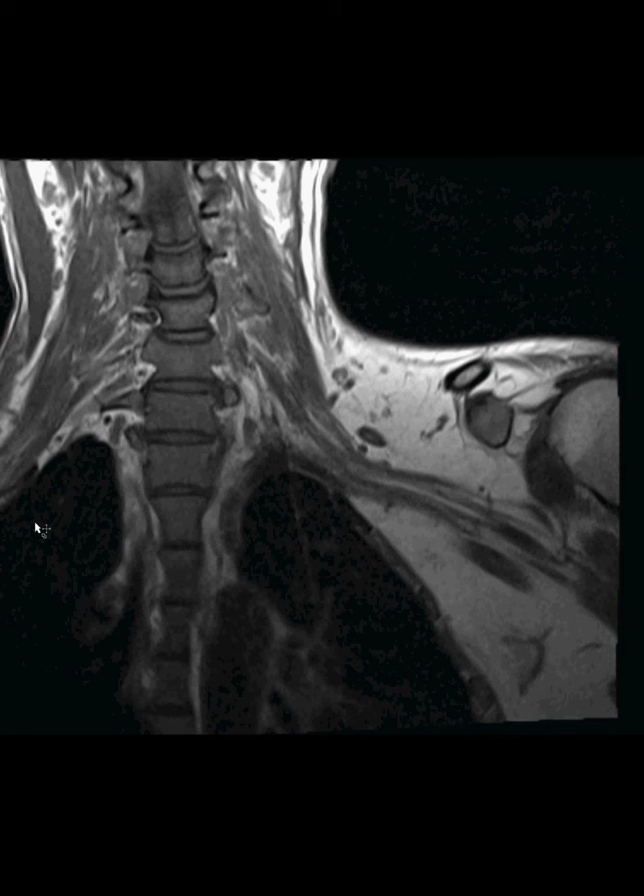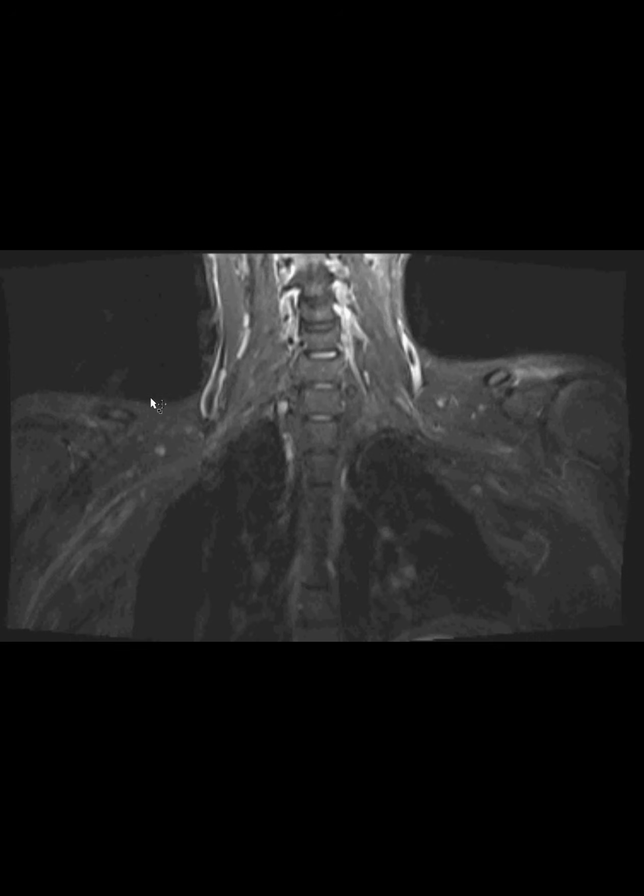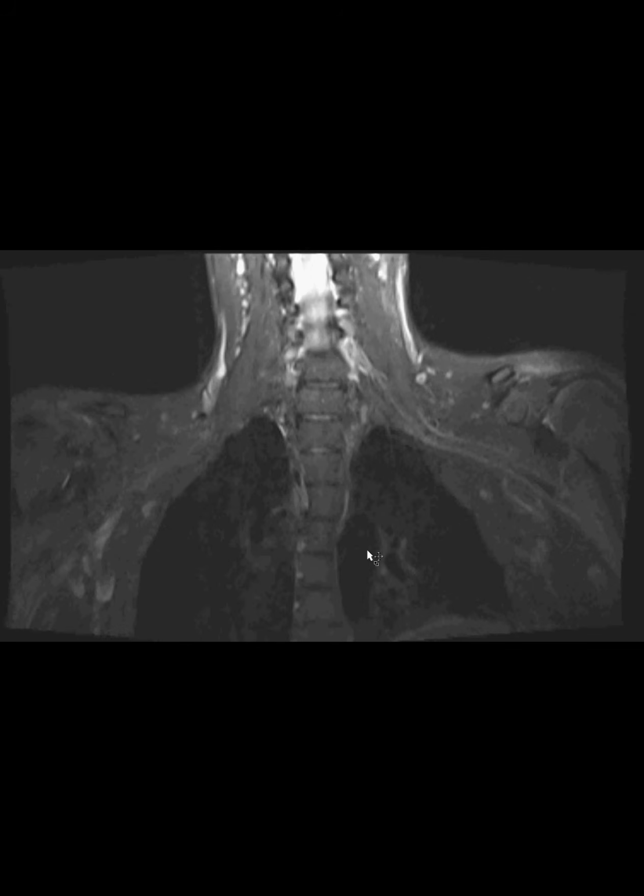here is, we start off with a rectangular field of view coronal STIR over both sides, and you can sort of see these faint, slightly bright lines coming through here. These are the nerves of the brachial plexus. They happen to go around or adjacent to the subclavian and axillary artery, which I'll show you in a second.